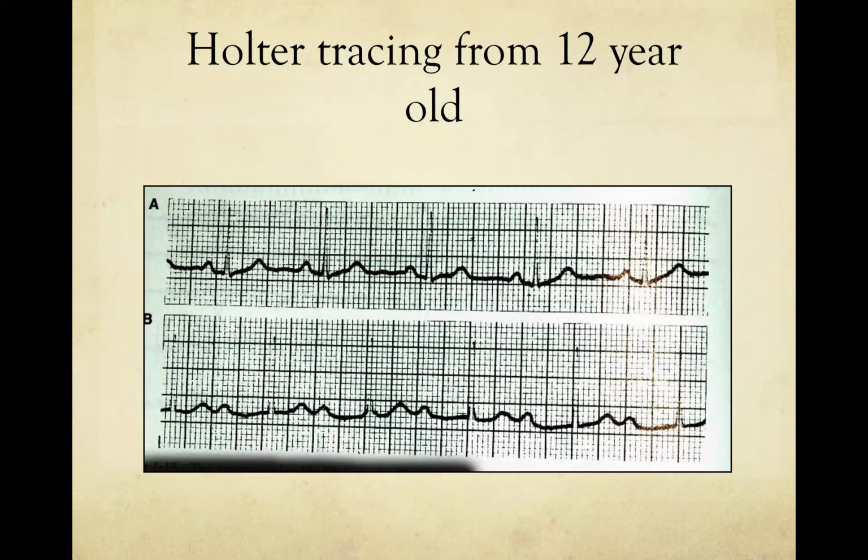Any other thoughts as to why someone could sometimes have what appears to be a very normal PR in panel A, but in panel B has a very abnormal PR interval? One option I was thinking is, could this be a sign that the patient has dual AV nodal physiology?